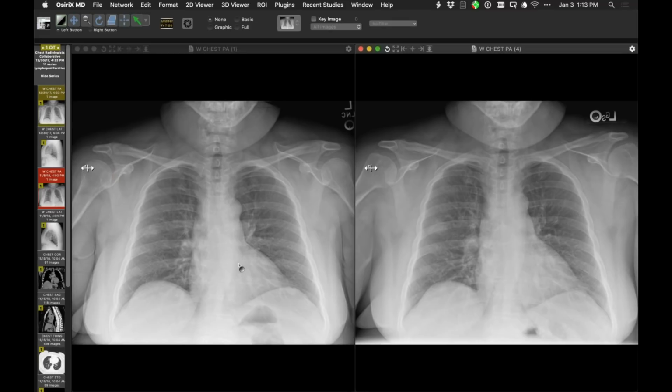So this is always an instructive thing. Why does someone decide that at this point in time that's a pneumonia? I don't know. But the only history I got back there was cough. I didn't see any history about productive cough or fever or anything else to suggest that that was community-acquired pneumonia, which of course it isn't. So it is enlarging over a period of time, but over a relatively large period of time.